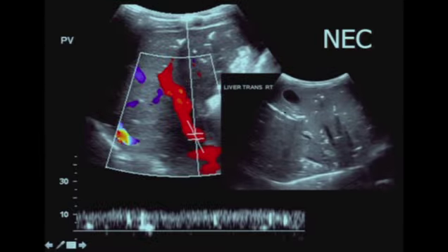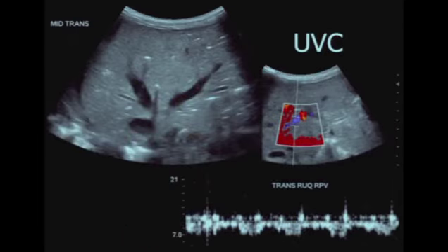And as we looked further as time went on, we could certainly come up with a lot of portal vein gas within this liver. Just because you see this doesn't mean they have necrotizing enterocolitis. If they have a low umbilical venous catheter and there's a little bit of bubble in whatever they're flushing, you can also get little dots of portal vein gas. You can get the artifacts when you interrogate the portal vein. So again, know what lines you have, know what's going on with the child. But Doppler is a very sensitive way to look for portal vein gas.